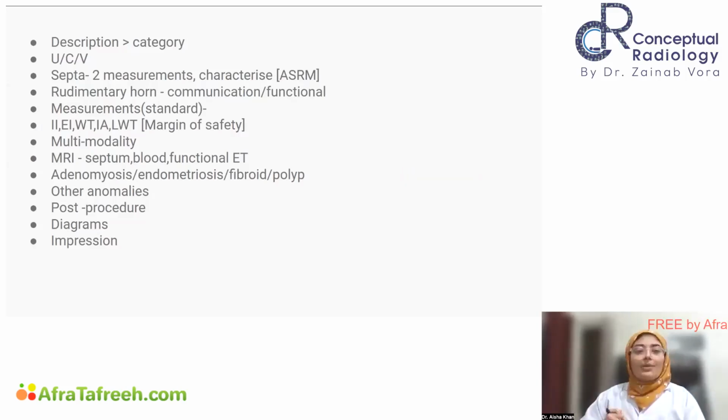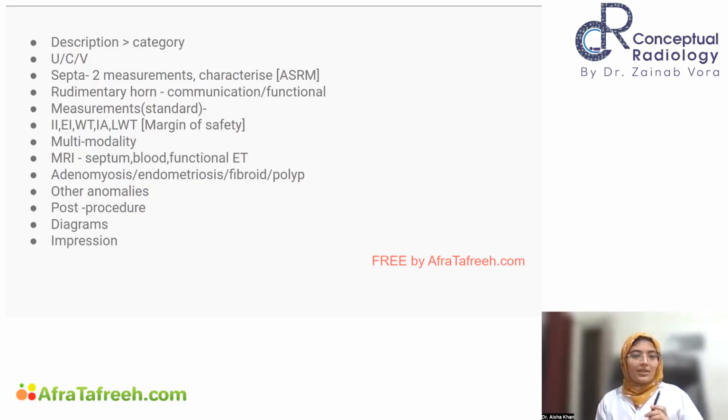ठीक है, so कुछ measurements थे जो कि हम एक बार में लेते हैं: internal indentation, that means cavity कितना dip कर रही है, external indentation, wall thickness और myometrial thickness, the angle which is there, indentation angle, and only in cases of T-shaped uterus we measure the lateral wall thickness also. ठीक है, ये सर्जन को help करता है, सारे measurements to decide the margin of safety. Multimodality approach any day is appreciated.